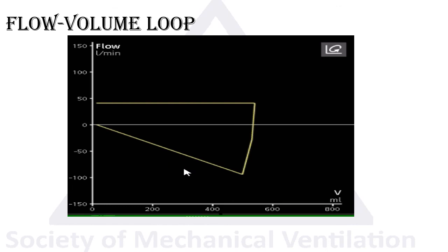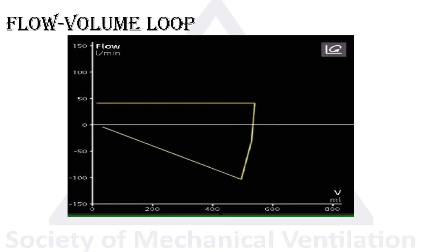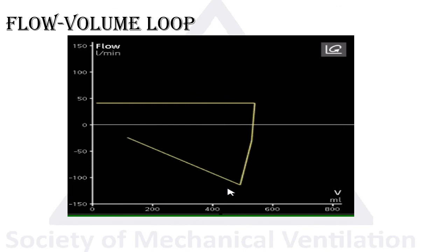The worse the compliance, actually, the expiratory flow will go down as the lung tries to collapse pretty fast. As you can see here, there will be a little pause.